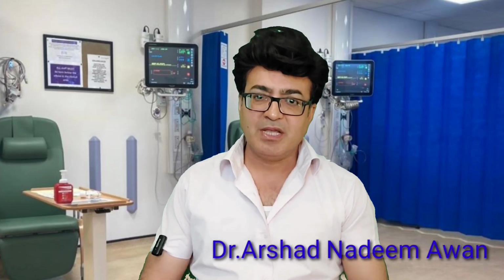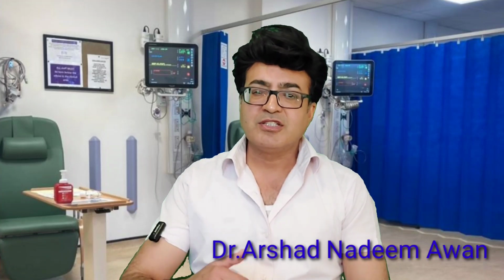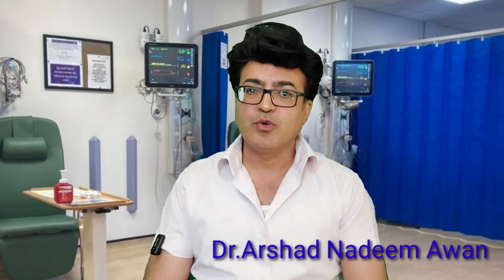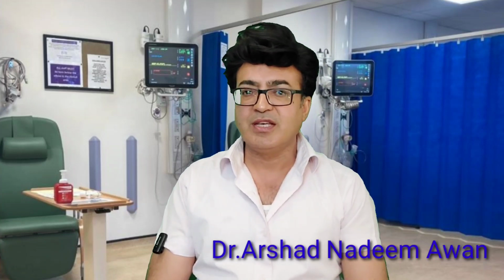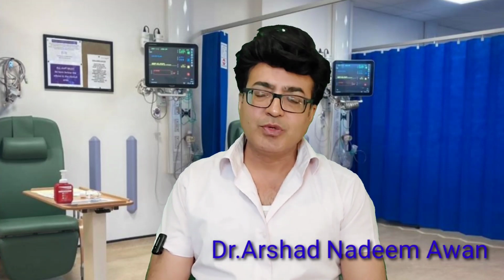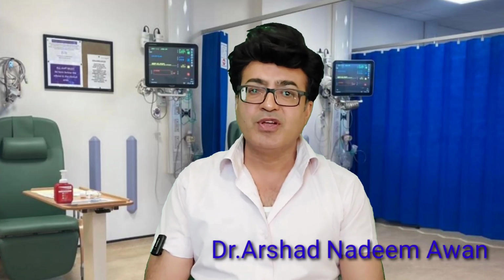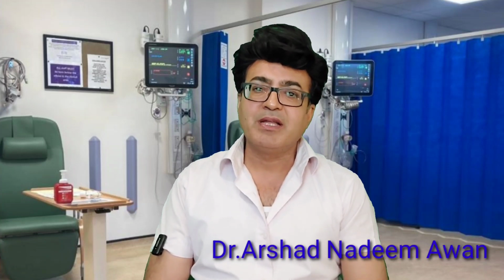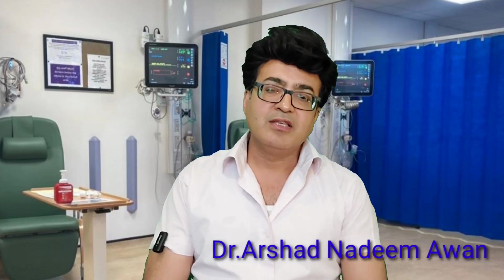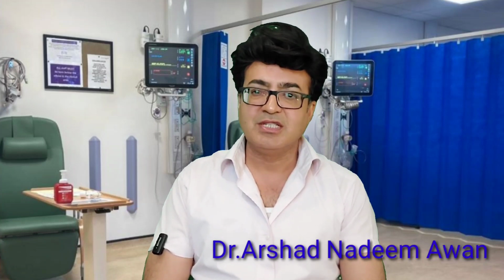What actually happens in ovarian vein thrombosis? Ascending infection spreads from the endometrium to the ovarian vein, and the ovarian vein gets thrombosed. On ultrasound imaging, you can appreciate ovarian vein thrombosis and also features of thrombophlebitis. But CT and MRI are the most confident modalities, where you can pick up thrombophlebitis and ovarian vein thrombosis quite confidently.